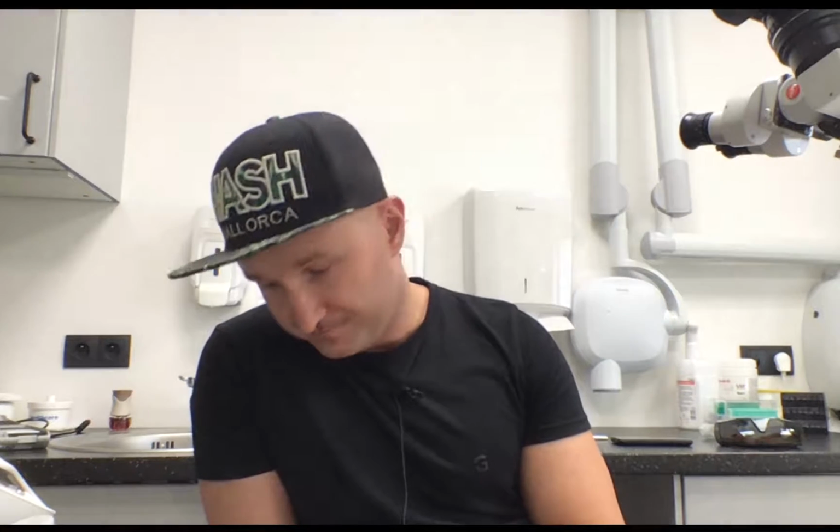When you work with soft tissues, you can use both possibilities. When you want to cut fast and effective and smooth, you choose the shortest pulses and high frequency. Then your cutting will be smooth and deep, but you will cause bleeding.